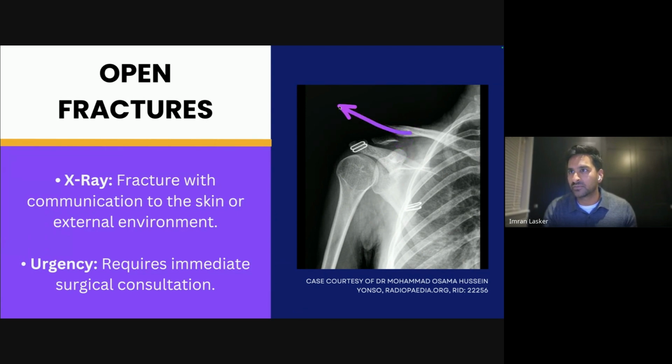It's kind of veered off that way. But the acromioclavicular joint is still in line. So there may be a ligamentous injury, so they may need to pull that back in place. You get a metal plate with screw fixation there. They may get some ligament, or they get this rope stuff to try and pull it back into place as well, to get everything nicely lined up again.